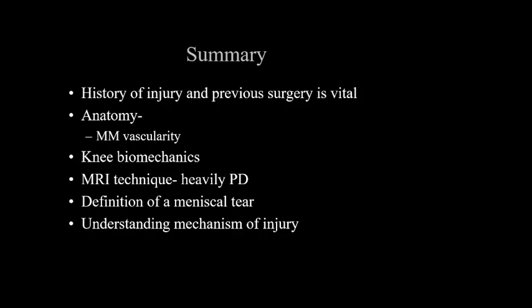And also we talked about the different mechanism of injuries for the cruciate ligaments, and also the value of describing the bony contusion. Sometimes the bony contusion is very helpful to predict what mechanism of injury the patient might have suffered. For example, we said lateral femoral condyle and lateral tibial plateau contusion would suggest pivot shift injury.